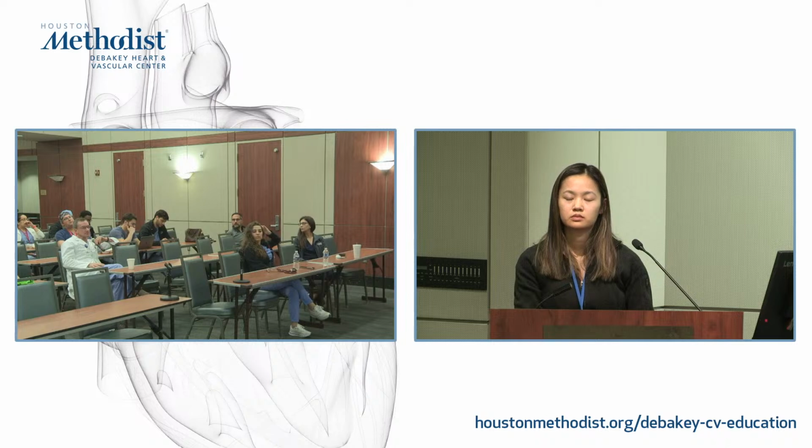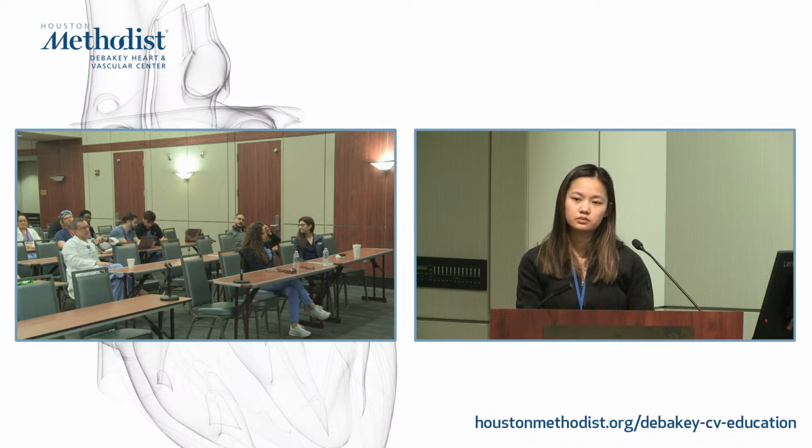And I say that because we get a lot of referent TEs from other places. And these are done in the community, and they may be done by people who aren't level 3 echo or don't do a lot of these screening cases. And invariably, on the 4-chamber-ish view, the LV apex is way off to the left, the annulus is canted at an angle, the X-plane is useless, and the 3D is terrible. That's the standard default referent TE that we get.